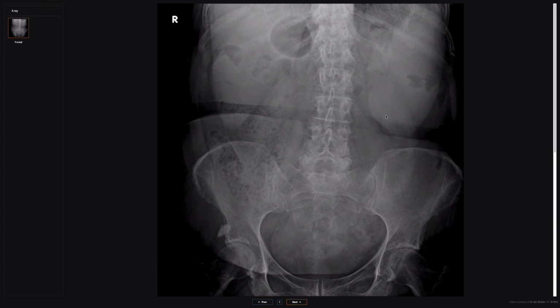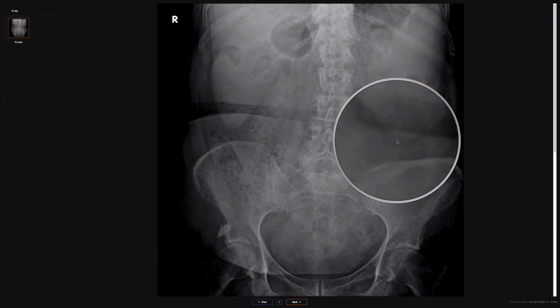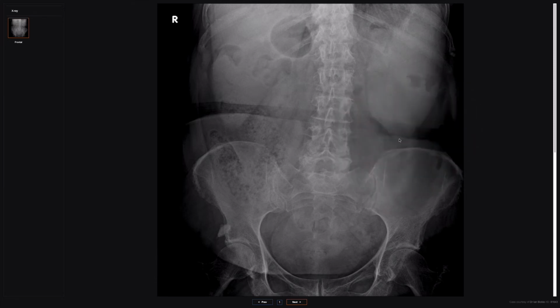That was a normal spleen. This is an enlarged spleen. So you note here where now the splenic tip comes down here just above the iliac crest. Okay, so this spleen has come out of the left upper quadrant, come well below the costal margin and pushing down here. This doesn't tell me anything about what's going on in the spleen, whether it's full of lymphoma deposits or whether it's just homogeneously enlarged because of some other cause of splenomegaly. So it's quite a blunt tool to tell us what's going on with the organs.